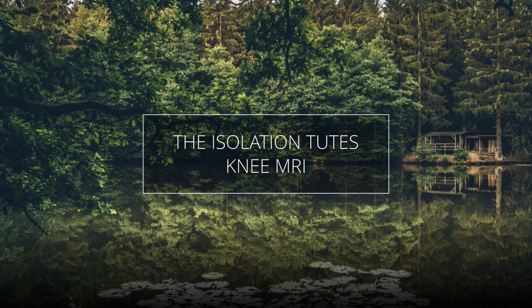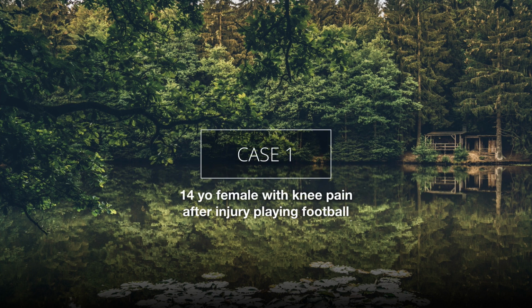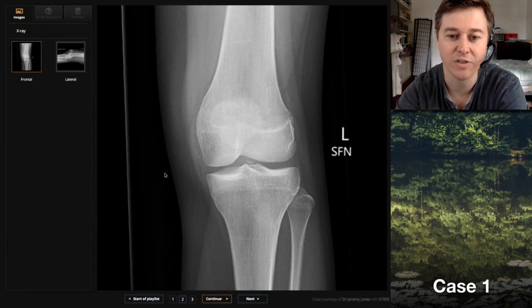All right, today we're going to do some knee MRI cases. So the first one is a 14-year-old female with knee pain following an injury while playing football. This is a case from the UK, so it was probably soccer rather than Aussie rules football. Who's going to have a look at this case?